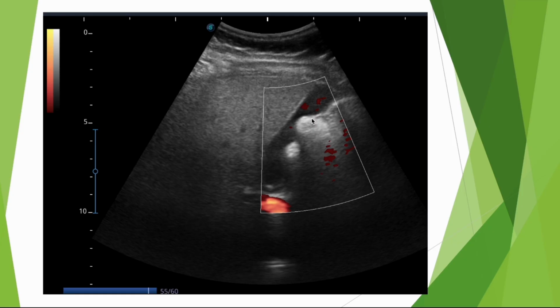The ultrasounds, your echoes, will partly bounce off the surface and partly get trapped. If you want more explanations, it'll be well explained in the training. This explains the highly echogenic surface appearance and the posterior anechoic area with a pure shadow. Here, the entire image is highly echogenic with an impure shadow. An impure shadow, which you might not know, is actually a gas shadow.